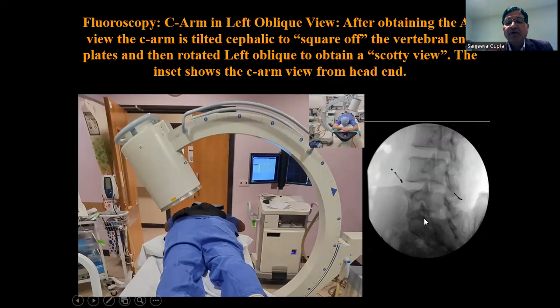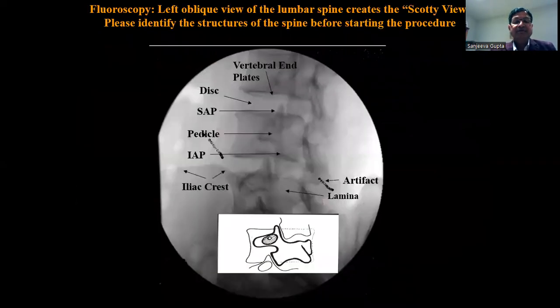That is an L5 vertebral body here. That is a pedicle, superior articular process of L5. Here you can see the superior articular process of S1. The iliac crest is here. So iliac crest is posterior, so you'll not be able to do any procedure here because the iliac crest will come in the way. Similarly, intervertebral discs, and the facet joints here, superior articular process. So identifying the structures in each projection will make the procedure much safer.